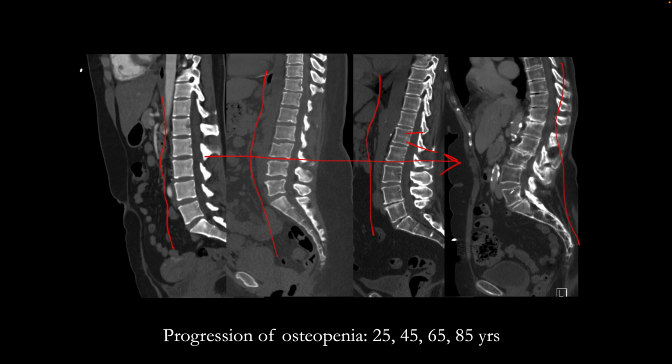And at the level of L1 vertebral body, if you make a region of interest and calculate the Hounsfield units, and if it is less than 100, it is very certain that if the patient had a bone density scan, they will have osteoporosis. So that's the criteria I frequently use in older postmenopausal women. At the level of L1 vertebral body, in a sagittal view, I find the most lucent area in the bone and measure the attenuation. If that attenuation is less than 100 Hounsfield units, I say in my report that the patient is likely osteoporotic.